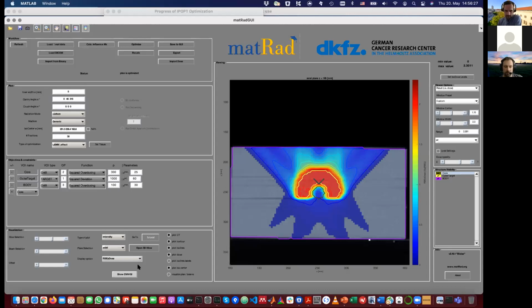All right. So let's have a look again at the different quantities that we see now here. Starting with the simplest, that's the physical dose of carbon ions that we have to deliver to then have a biologically effective dose of 2 gray.